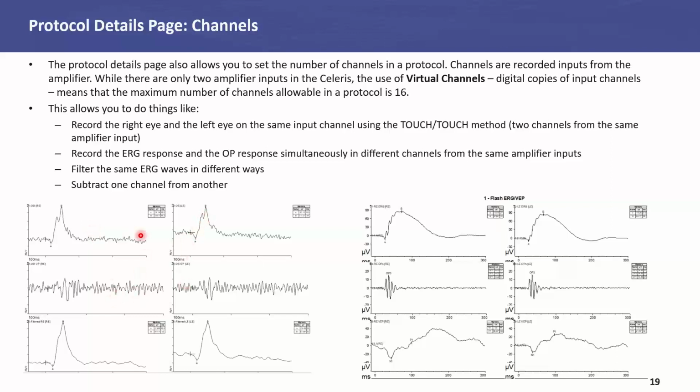So these are digital copies of the ERG channels that are filtered much more tightly, so you can exclusively see those oscillatory potentials. And then down at the bottom, we have a digital copy of those ERG channels again, but this time it's filtered more aggressively, so that we can remove those OPs and get a little bit easier and clearer placement of the B wave.